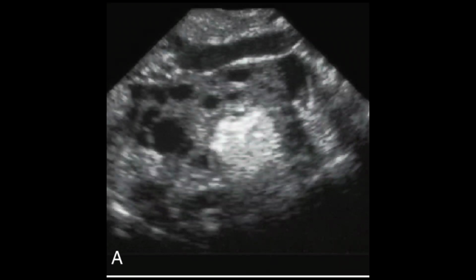Transabdominal scan will not help you in this regard, because this lesion echogenicity will be quite confusing with the bowel content. There will be reflective echoes from the bowel as well, so you won't be able to appreciate that. Only the transvaginal scan will help you to identify the ovary, and within the ovary this dermoid can be seen. So this is an example of dermoid lesion, and dermoid may appear in this fashion, and it may appear within the ovarian parenchyma.